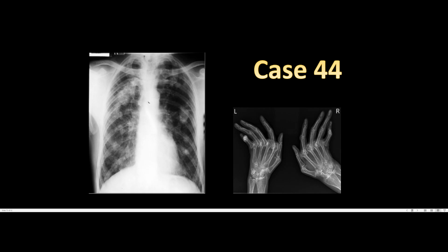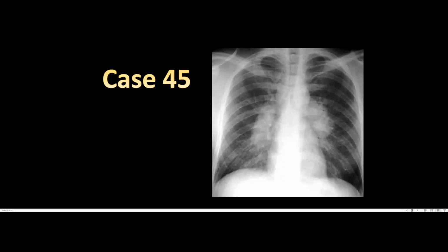They must occur at the same time. They both must be active. If you have multiple pulmonary nodules, it might be malignancy. Or this could be pleural plaque. You don't know. This person might have asbestosis, an interstitial lung disease that has progressed into mesothelioma. But this is more than likely pulmonary nodules with rheumatoid arthritis manifestations. Regardless of the case, with rheumatoid arthritis with respiratory manifestations, you need to think of them both together as Caplan syndrome. All right? Again, look at the findings, get the patient's history, you'll connect the dots. All right? So this is the incidental finding.